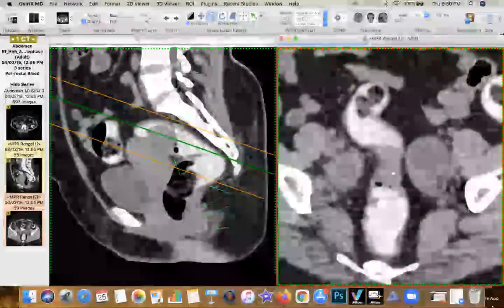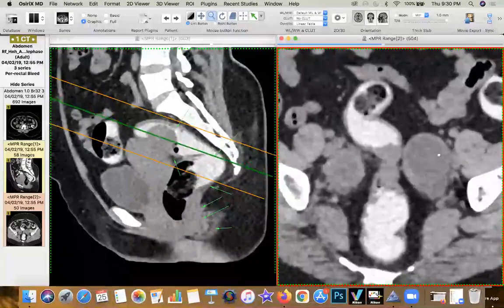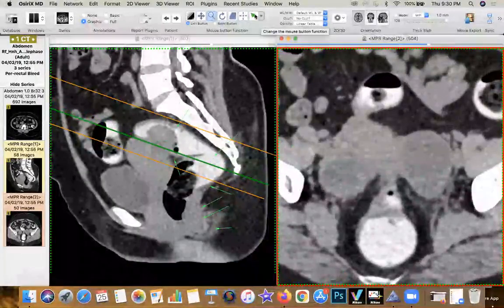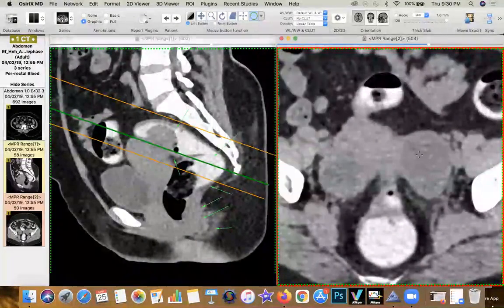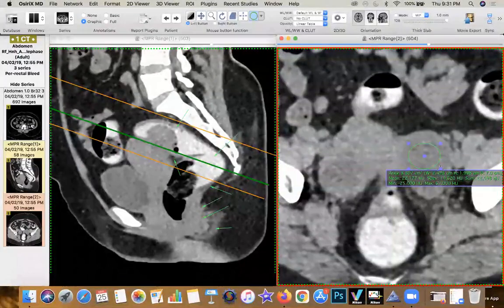But what was unusual with the same patient was that not only were you having thickening, but you were seeing bilateral adnexal mass lesions. And these mass lesions were not normal attenuation. When you're seeing normal ovarian attenuation, it's more fluid-like, simply because it contains fluid, usually in the range of about 2 to 10 HU.